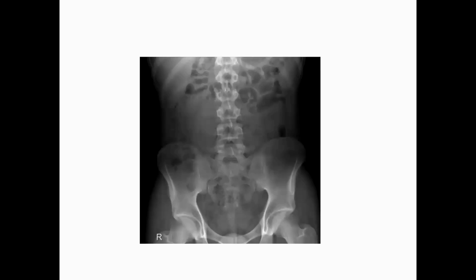Then after that, other than soft tissue, what you're going to see in the abdominal X-ray is the normal bones. So here you'll start with the lower ribs. So these are lower ribs, right side, and this is the left side. And then lumbar vertebrae. These are lumbar vertebrae. Maybe you're going to see any incidental findings. You need to comment on it, for further investigation, for further follow-up.